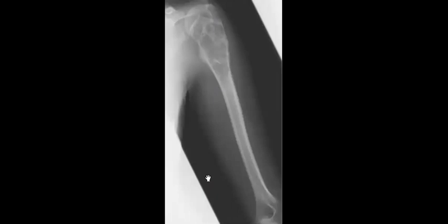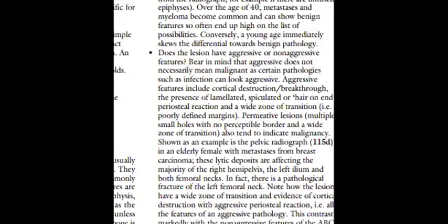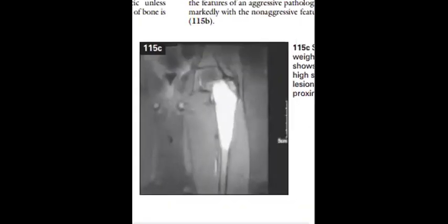So let's see the MRI of a patient. I think this one. Yes. So this is the MRI. You can see the very high signal on T2 in MRI. And I think if I show you this one, yeah, fluid signal. So what do you think about this one?